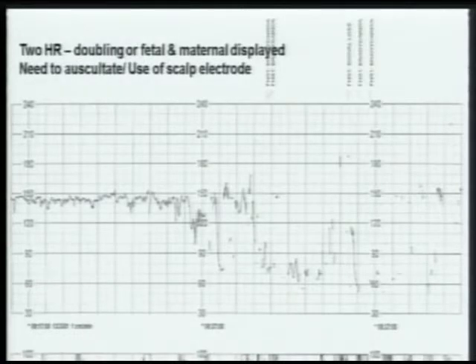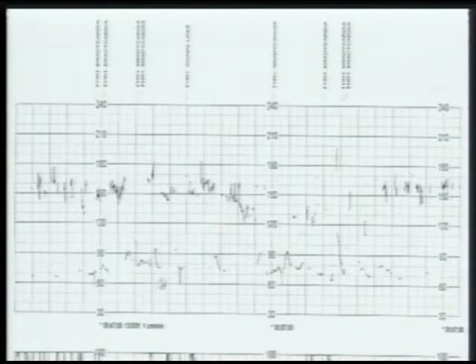The other issue with fetal heart rate monitoring is, if you are using oxytocin, the uterus becomes more and more sensitive as the cervix dilates. So although you haven't touched the oxytocin, as the late first stage and second stage contractions become more and more, and when the fetal heart rate drops, sometimes the machine doubles it up. If it is on a fetal ultrasound mode, if it is 75, it shows it as 150. So there is 75 here and 150 here, and that is due to hypercontractility. And the doctor thought this was the mother, but this is really the fetus doubling as 150.